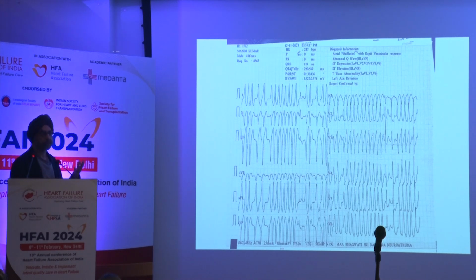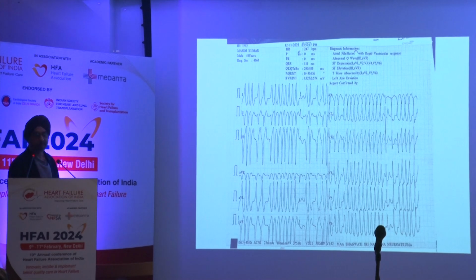the electrophysiologist, it's a very important ECG, because now it's all pre-excited beats. He knows where the location is. He doesn't have to rely on the sinus rhythm ECG. He can map it out. So in V1, V2, there's a distinct change, and it suggests a septal location. And leads 2, 3 and AVF are negative, so it suggests a posteroseptal location on the ECG.